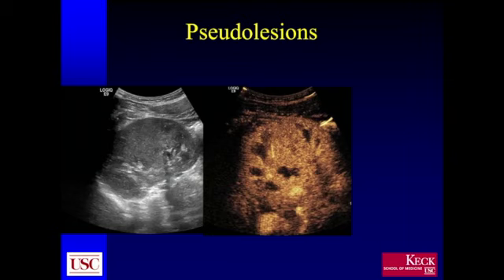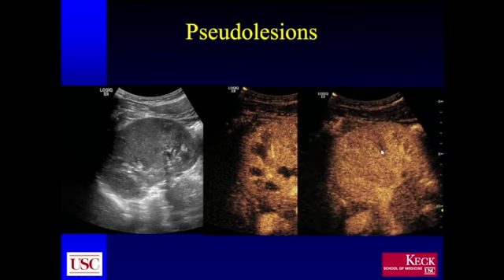You can see in the early or nephrographic phase that there is equal intensity of this area to the surrounding regions of the cortex, and that the timing, although you'd need real time for that, was similar. So originally we suspected that this probably does represent a column of Bertin or one of these so-called pseudolesions, and clinching the diagnosis is this image, which actually shows a pyramid within.